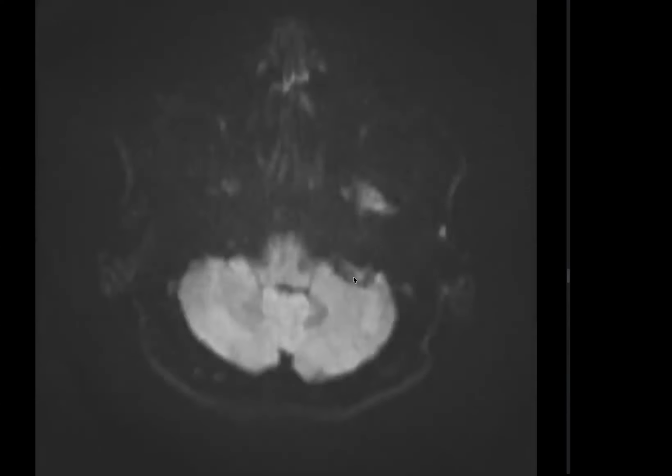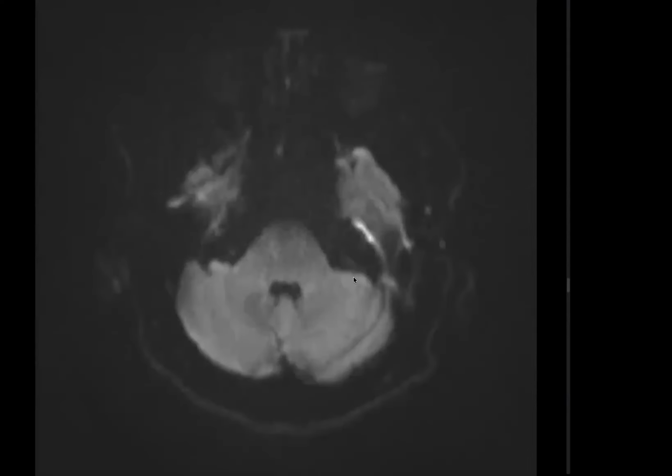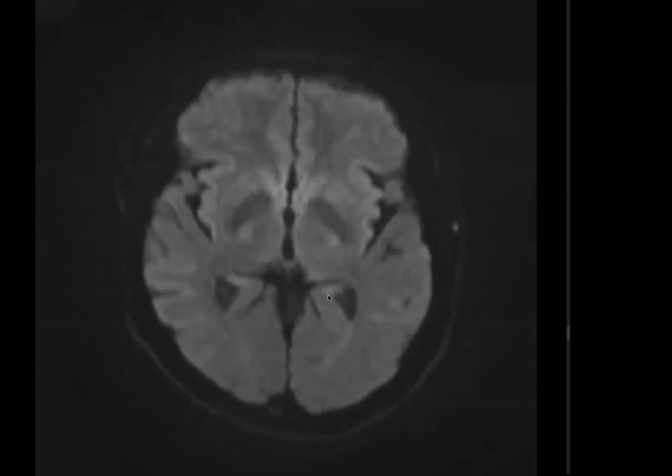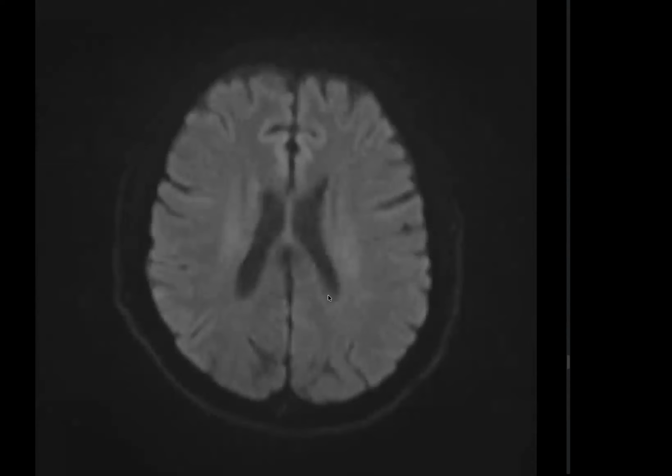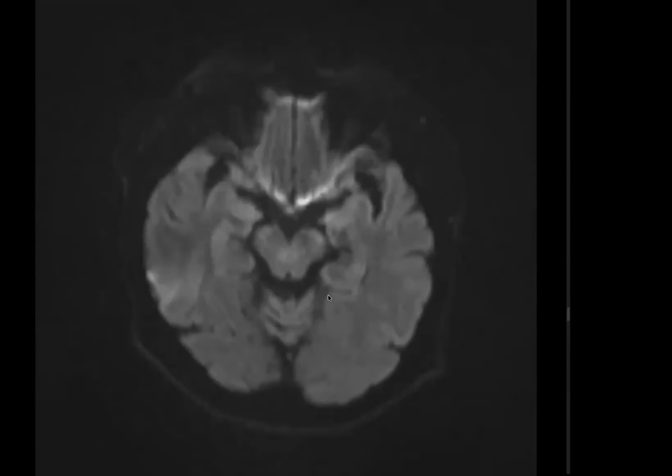Which sequence or plane do you prefer when you want to evaluate the sinuses? I will look at the FLAIR and MR venography. If you don't have it on a standard MRI brain, you raise the suspicion and then you order a venography. You don't directly get a venography unless there are other factors that increase your pretest probability really high.